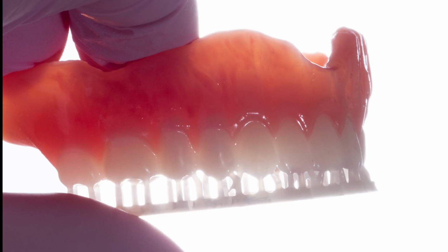Teeth printed really fantastically. Here's the final product. Amazing that this is free. Shout out to Truabutment for providing this service to all the dentists out there to be able to do this completely $0, free of charge.